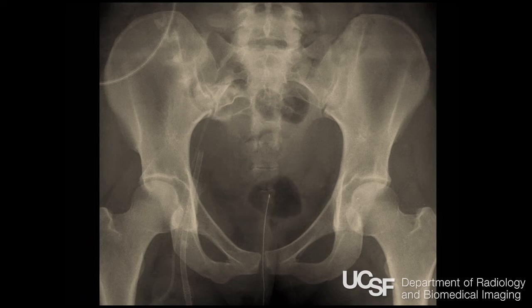In a lot of fractures, you don't see the fracture line. All you see is buckling. Classic is the torus fracture in the kid's radius, but also the sacrum. Look at these arcuate lines. This is a buckle fracture. This should mimic this, a nice smooth curve. And that's a lateral compression injury of the sacrum.